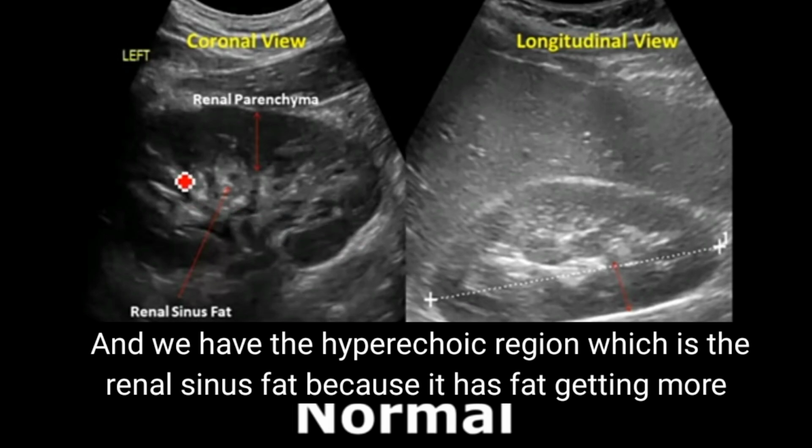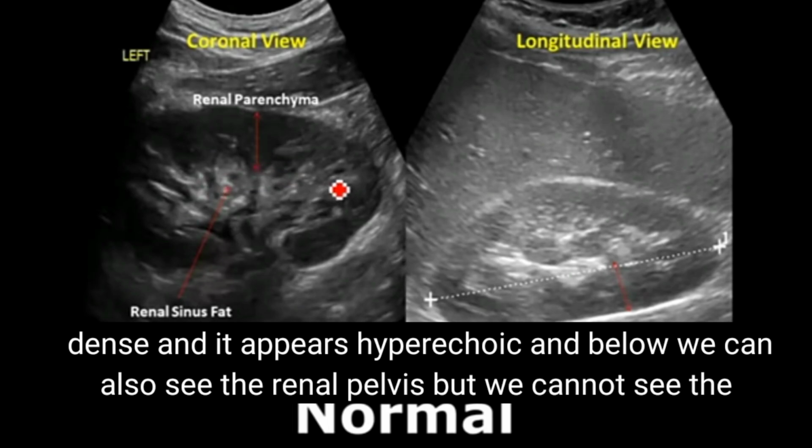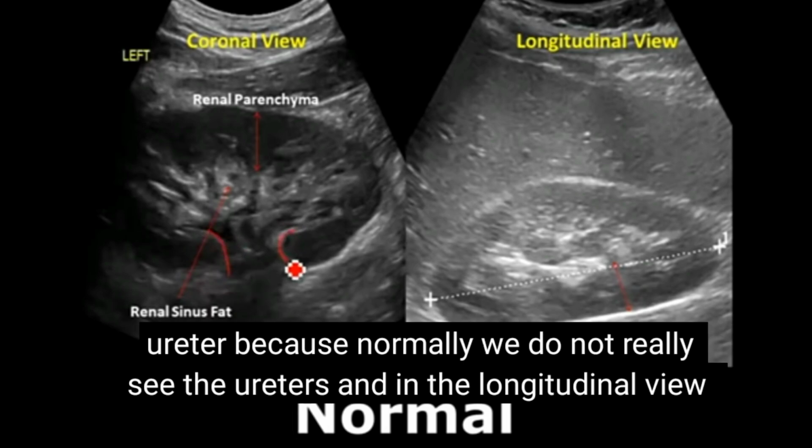And we have the hyperechoic region, which is the renal sinus fat, because it has fat getting more dense and it appears hyperechoic. And below we can also see the renal pelvis, but we cannot see the ureters because normally we don't really see the ureters.